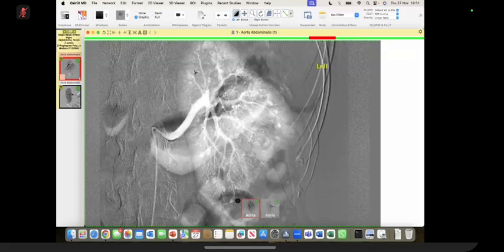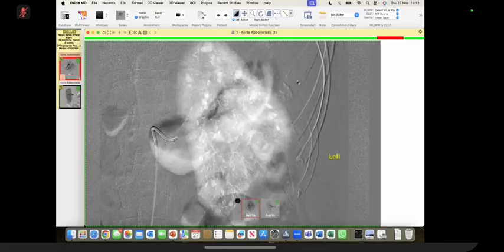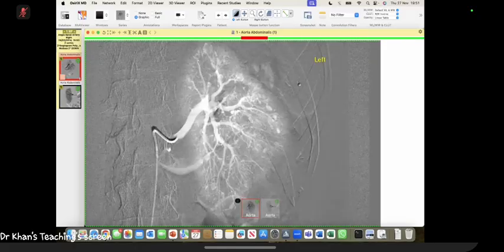Okay, so here I'm provided with the images. You can ask for the mouse, you can scroll through because they are serial images, I believe. Yes, sir. Can you scroll and it will change? Okay, so I'm not getting the option of it. I think I'm still having the control of the screen. Yes, I'm still having the control.